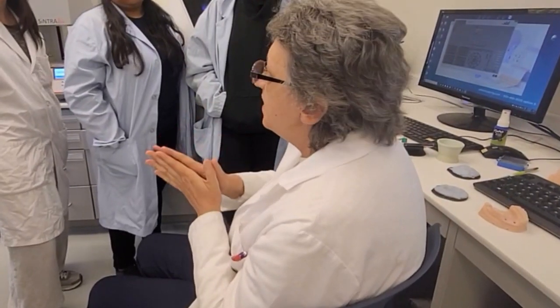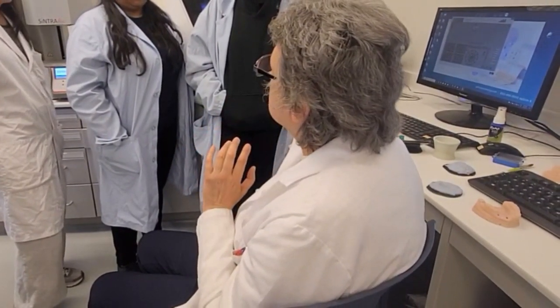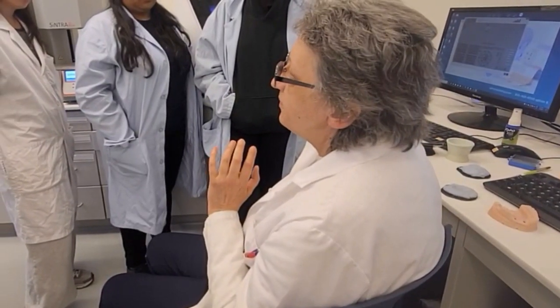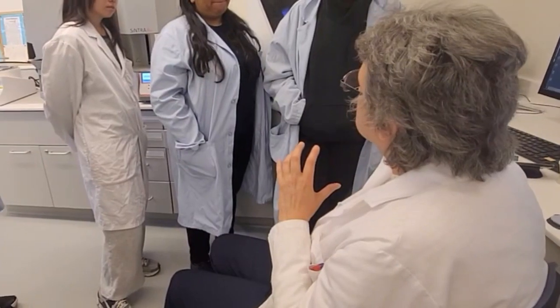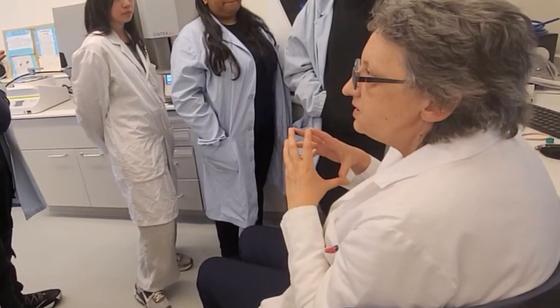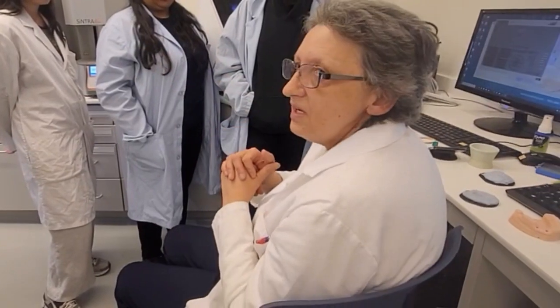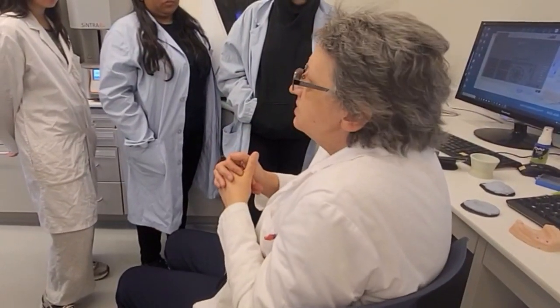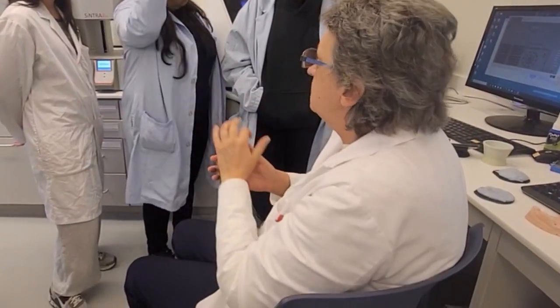Now, scan flags are typically called this when we're talking about a structure that can be identified by the software. But let's say I have a denture, and on a denture I can put a scan flag. Where am I going to put a scan flag? The scan flag goes straight into the replica in your model.